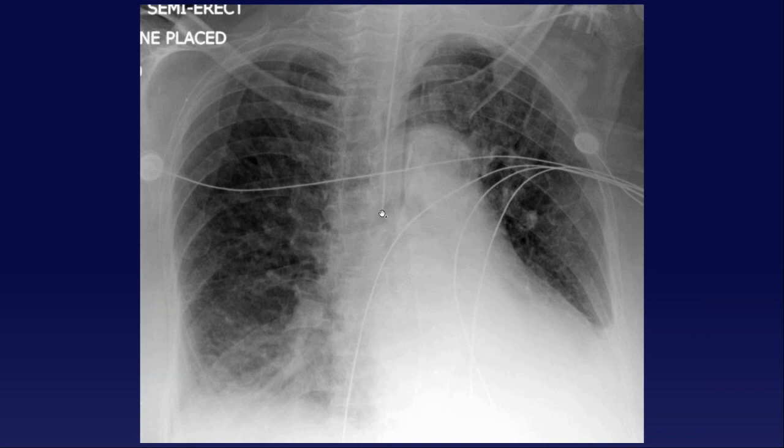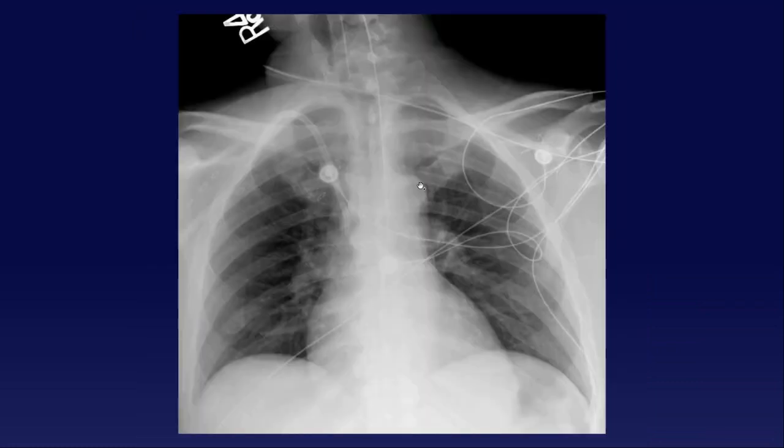Okay. Hey, and by the way, guys, thank you for asking questions. Please, please, please ask questions. I want to make sure you guys understand this. And if I'm an inpatient in the hospital, I want you guys to do a good job looking at my radiograph. Okay. How about here? Any thoughts?